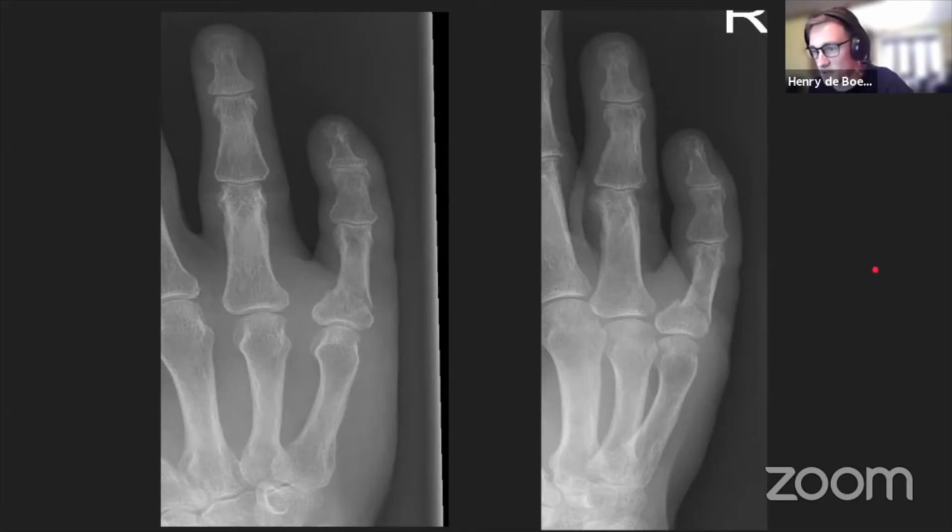Yeah, so it's starting to get some correct answers coming through in the chat. So this one is quite straightforward. So again, tracing all the bones on the AP. Looking okay so far. Yeah, and here there is a fracture.